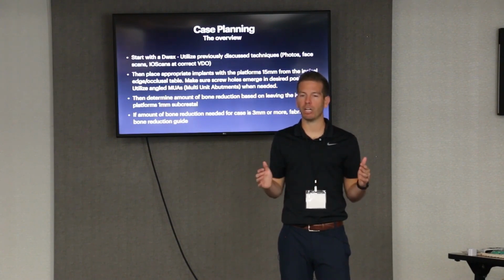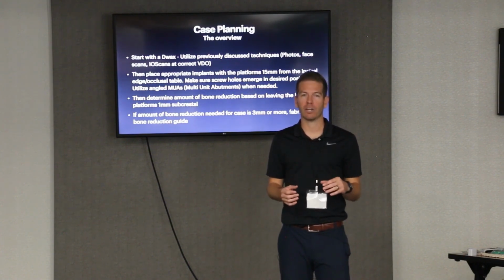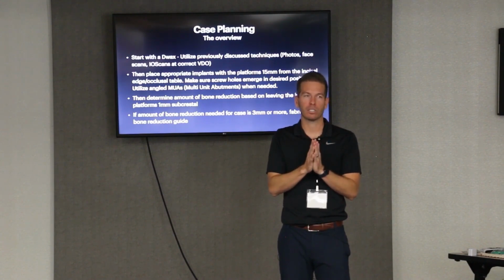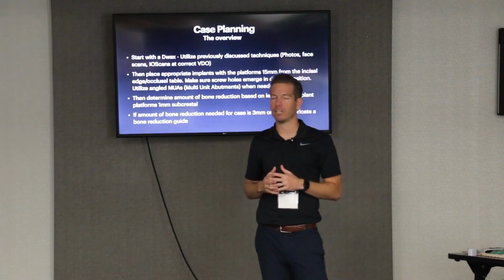So think denture module is like the global positioning for an arch of teeth, and the crown and bridge is more your fine tooth, individual tooth movements. So, you may start in the denture module and you may finish in the crown and bridge just to fine tune.